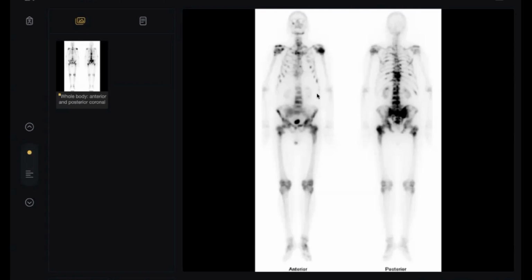So in this patient, there is increased uptake in the central pelvis, so this is likely a prostatic carcinoma. Is this male or female? Sir, this looks like male. I informed you in the history.